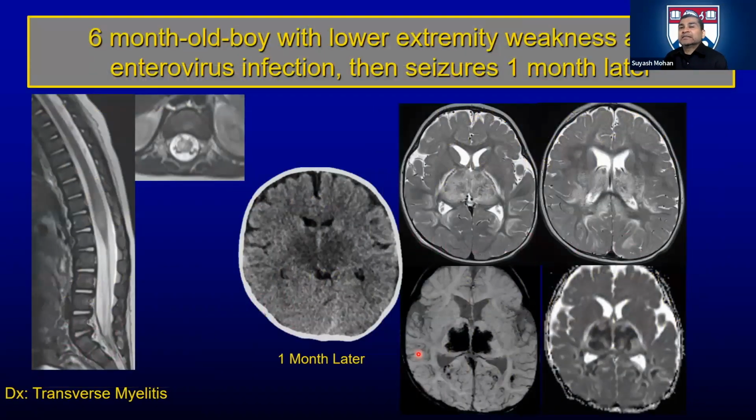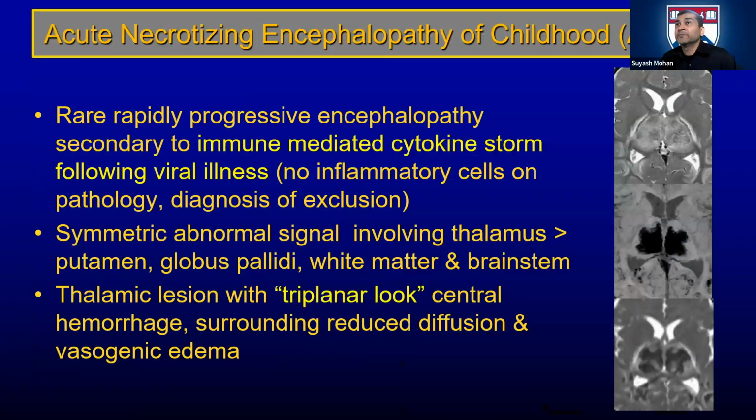Now, another encephalitis that typically affects the thalami in a very classic type of distribution, right? This is called trilaminar pattern, trilaminar hemorrhage, trilaminar hook-like appearance, susceptibility in the thalamus in a young patient or relatively young patient is diagnostic for acute necrotizing encephalitis.